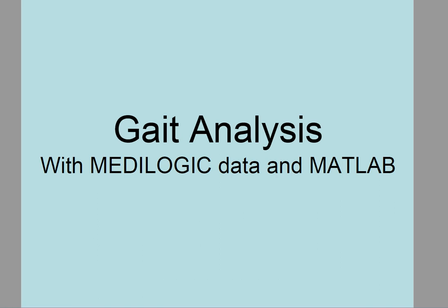Welcome to this video about gait analysis, and in this special case with pre-recorded data from Medilogic and the data treatment with the software MATLAB. In this video I will show you the workflow, what is to do for the data treatment and which steps are necessary to make the data treatment.